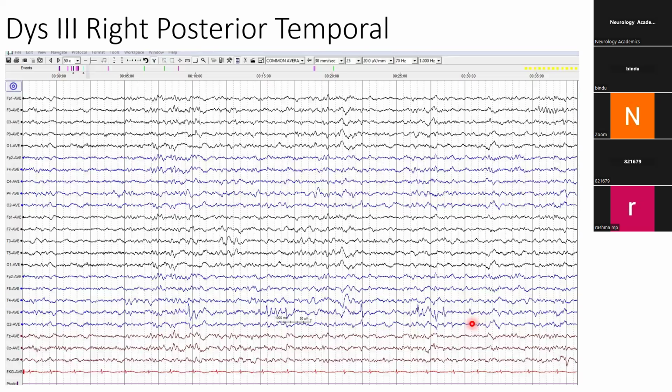The ones which come under that are, of course, all the spike and spike-wave discharges, and second is your TIRDA. Unlike FIRDA and OIRDA, TIRDA has been proved to be epileptogenic and is almost similar to what you get as spike and wave discharges in the temporal region. Second, when you qualify the PLEDs, that is periodic lateralized epileptiform discharges, which are now renamed, whatever it is, that also comes under that.